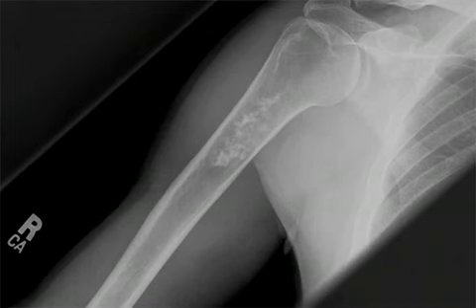Here we have a radiograph of the right humerus in a patient that we know from the history is 56 years old. It's an incidentally detected lesion in a patient who came in with shoulder pain, and we can identify this focal, irregular, radiodense lesion in the proximal humerus. Let's zoom in and take a closer look.